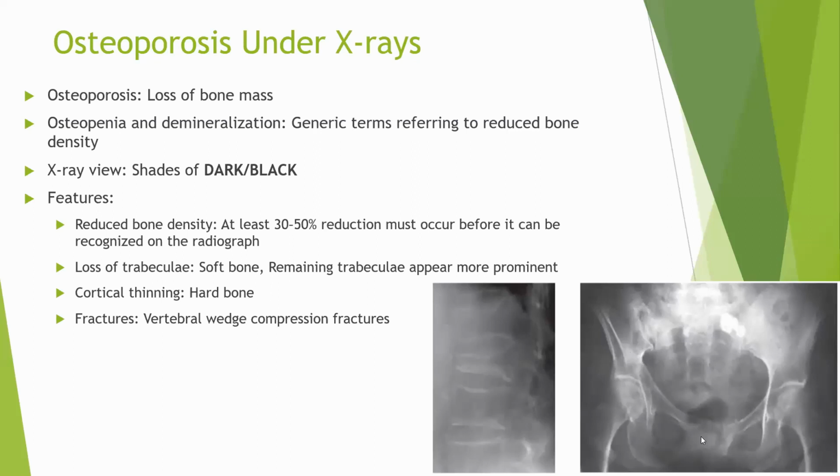And this is actually, let me check, a 57-year-old post-menopausal individual. This is the x-ray of a 57-year-old post-menopausal individual. What is this area? This is probably because the individual had a filled-up bladder, and that's what it is. The impression is showing urine or fluid in the pelvic area.